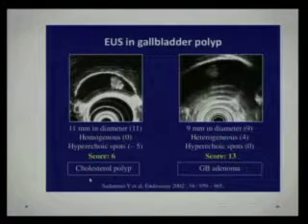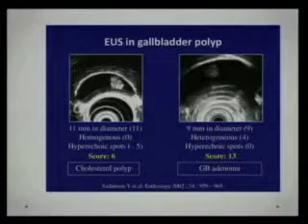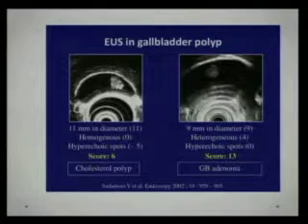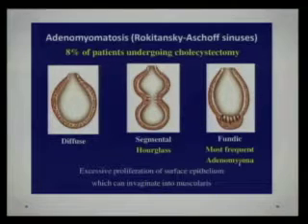More echogenic spots within the gallbladder polyp point to more cholesterol crystals in that polyp. That points to more echogenic, more benign it is, and less echogenic foci, more malignant it is. You see what I'm saying? The more echogenic or hyperechoic spots, the more likely it could be cholesterol. The fewer the hyperechoic spots, the more likely it could be an adenoma that could become a malignancy.